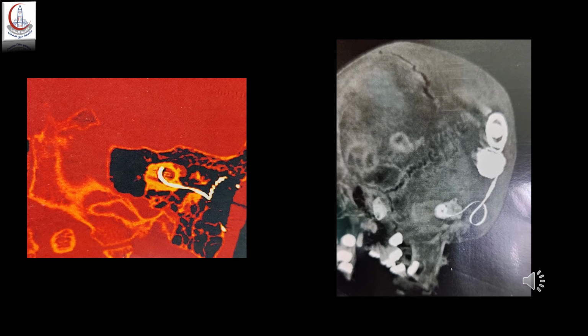Unfortunately, sometimes we can have problems, especially in patients who have been implanted and then you or your audiologist notice that there is a deterioration in the performance of the apparatus, and you image your patient to see what is happening. For instance, this young girl had a trauma to the head and the electrode started to be displaced outside of the cochlea, and as you can see, the electrode has been drawn out of the cochlea, and the performance of the implant was going down and she was not getting any benefits.